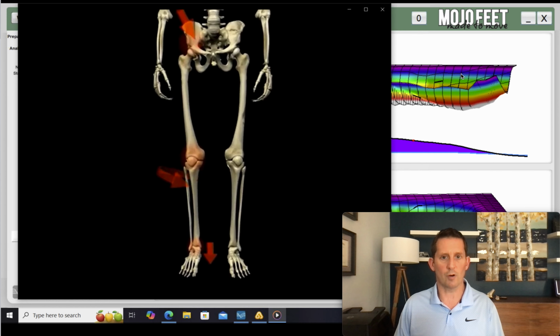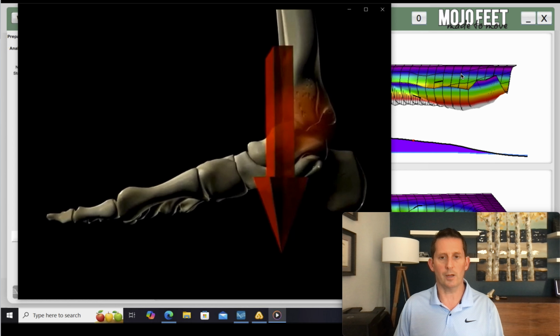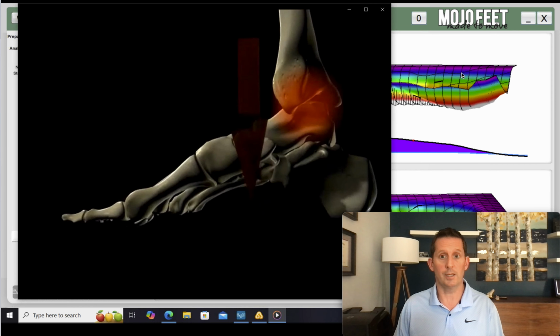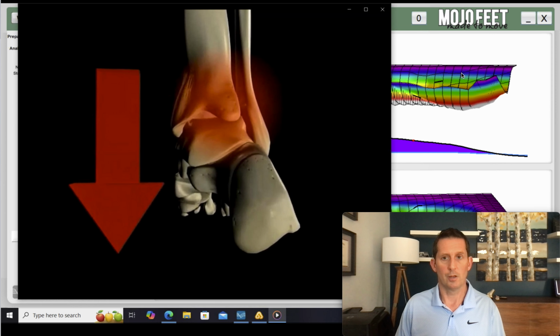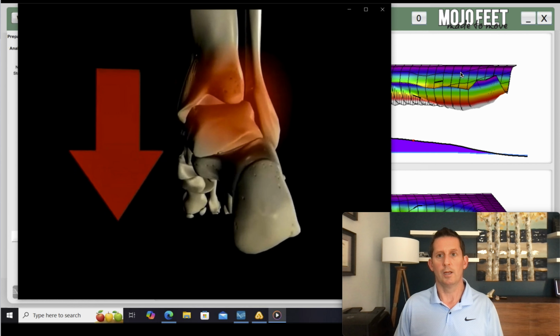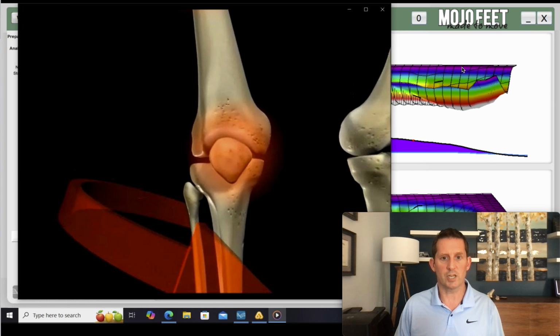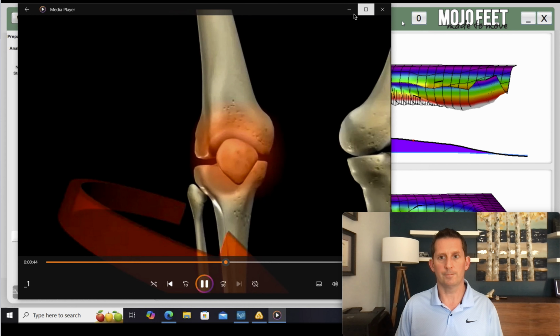It helps describe and show why we might be thinking about the feet clinically when we are talking about, say, hip pain or back pain. Some offices leave this video on as a screensaver to help with demos for patients, but it's a good way to chat and illustrate for patients why the feet are important.